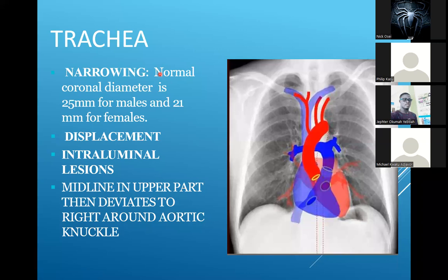Now the trachea. I said that when you finish identifying the X-ray, the name, age, sex, and the type of X-ray, whether it's AP or PA, the next thing you want to look out for are the technicalities: whether it is adequate or not, underexposure or not, whether there's centering or not. We've talked about how to find out. We mentioned that you see whether the patient was rotated or not by looking at the distance of the medial ends of the clavicles to the spinous processes. We mentioned that, so don't forget that.